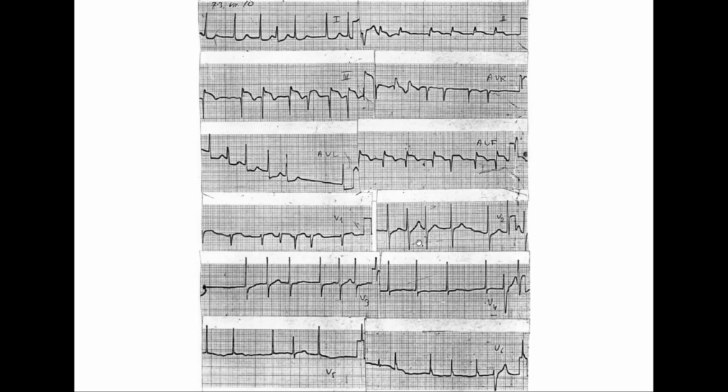So it can indicate that this patient has an infero-posterior acute myocardial infarction. Okay? That's because in V2 the R wave is too big. In the normal progression, in V1 the R is small or nothing. In V2 the R is getting bigger, but the S is still deeper than the R wave. In V3 the R is still smaller than the S wave, and in V4 the R is bigger than the S. Here V2 already has an R that is too big. Because it's too big and the patient has an inferior MI, you can diagnose an infero-posterior acute myocardial infarction. Okay? Good.